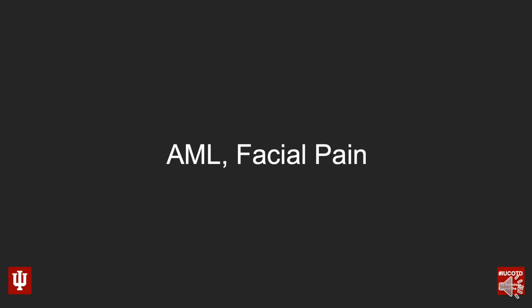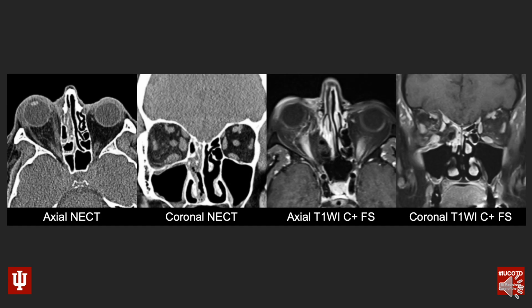Okay, so the history on this case is a patient with AML who came in with facial pain. Again, acute myelogenous leukemia and facial pain, and we have 4 images to look at this time.